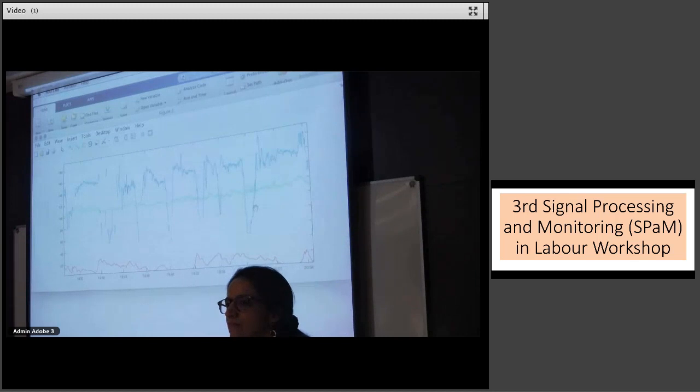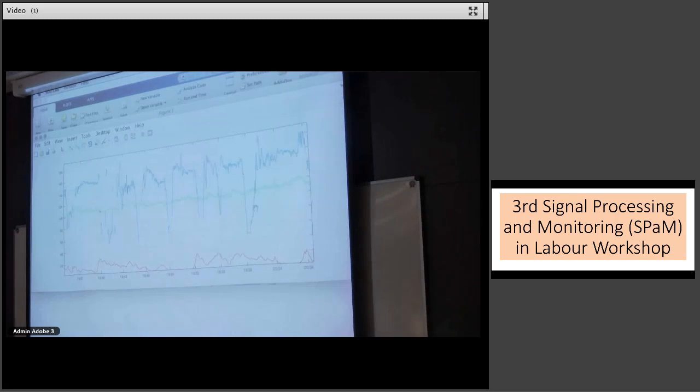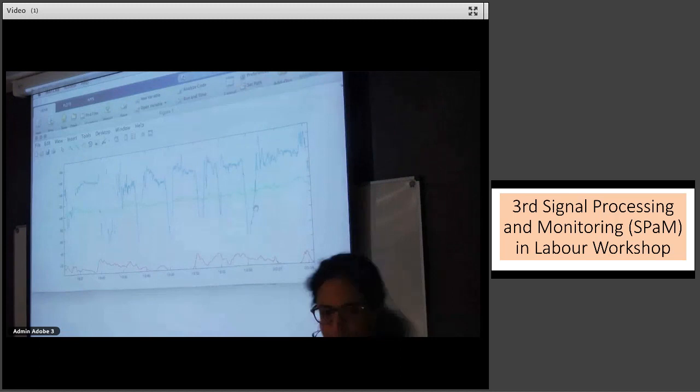Once a baby begins to get late decelerations, they will deal with this contraction, that contraction, the next contraction, and so on and so forth. So it's not something that babies can switch on and then switch off. That's why I wouldn't classify this one as late deceleration. But if you just look at it, it is late in the sense that it appeared after the contraction. But it doesn't carry the clinical meaning or physiological importance of that.